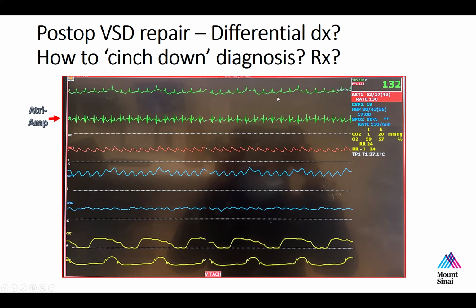Yeah, these two leads are simultaneous. And we know from the surface lead 2, this is clearly the QRS, right? Yeah, this corresponds to the QRS. So then the atriamp is doing what? What does the atriamp device do? It points out where the P wave is. Yeah, it augments the atrial electrogram, because the device is literally attached to one of the temporary atrial leads.